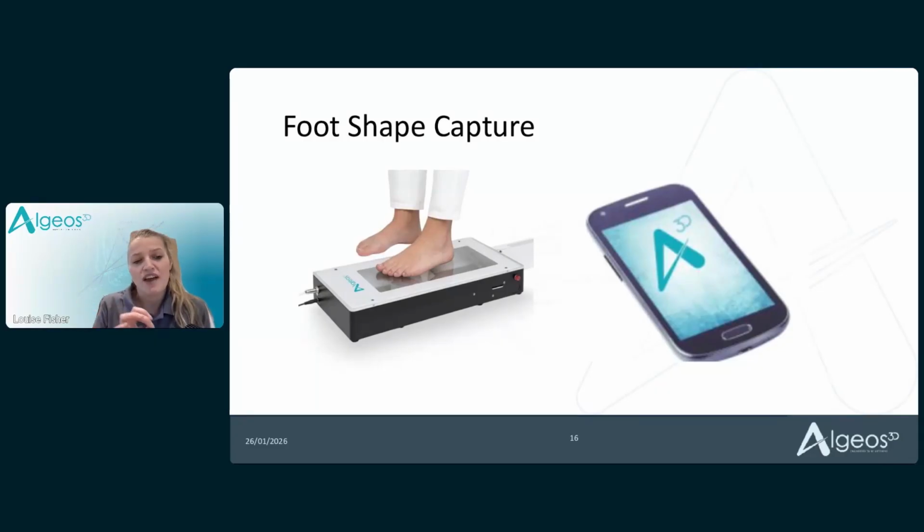And we said there's very little human process in this. This is a fully digital process. So what is very important to note is the data that you get from your scan is going to feed through every step of the process. So what does that mean clinically? Well, it means if you take a weight bearing scan, that foot data will be different if you take a non-weight bearing scan. A non-weight bearing scan, you'll have generally a higher arch profile.